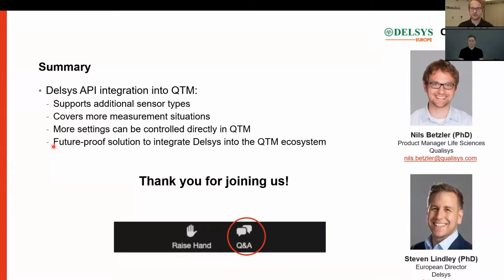You could also see that more settings can be controlled inside QTM directly. Depending on what questions come up, we can take a quick look at that again later on, because you can now set different sensor modes directly in QTM.